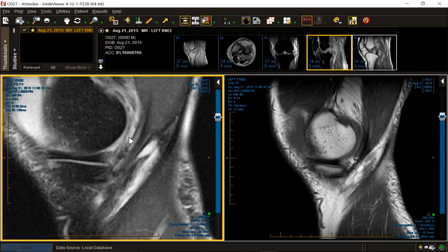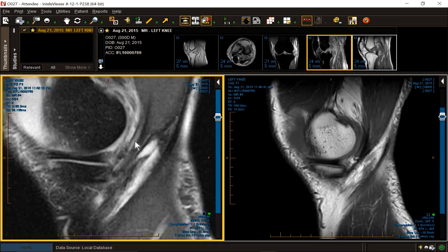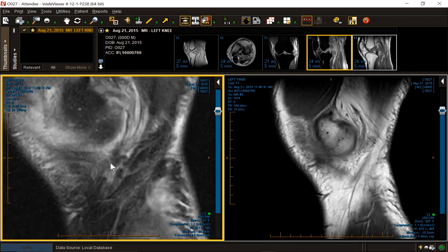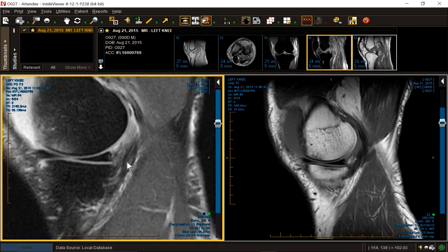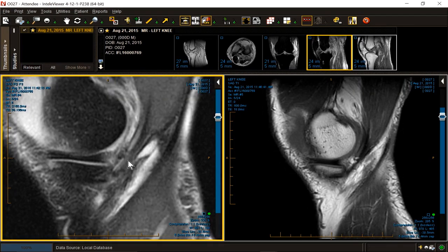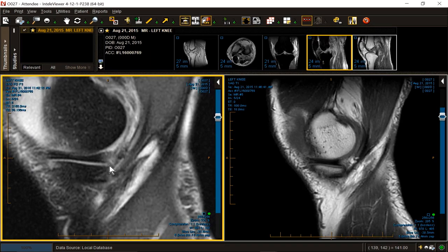Let's go over to the medial side, where things are not quite as dicey. But they're not quite so good either. So there is a block-stop mechanism that keeps the posteromedial meniscus stable. So when you flex your knee, it keeps the meniscus from rocking back and forth. And what does that is the semimembranosus tendon. So here is the main tendon insertion, the direct head insertion, and that inserts on a little tubercle of the tibia. You can see it's a little fat and a little swollen.